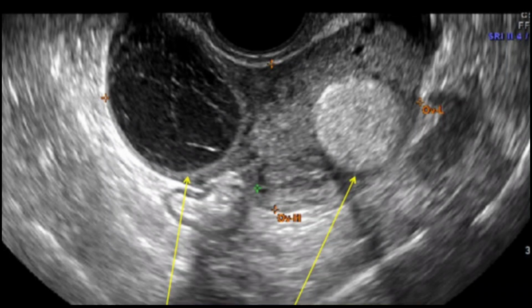Straight away advise the patient for further radiological imaging, MRI, because MRI will pick up all these points, these small hair follicles, or this could be tooth or any nail particle, as these are all skin derivatives. So the MRI scan is the pertinent radiological modality for this dermoid cyst, and after that refer the patient to the gynae department for further proper management.